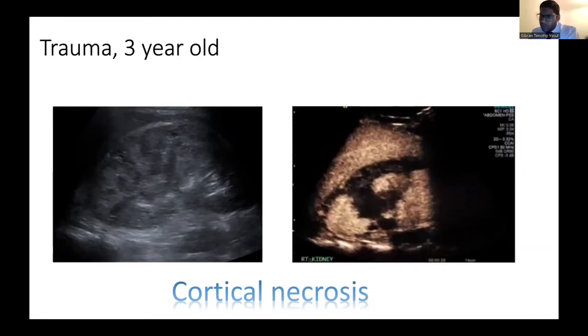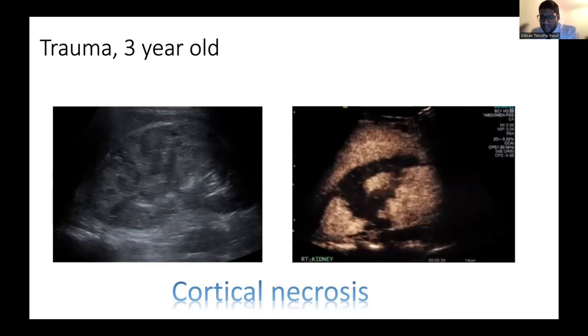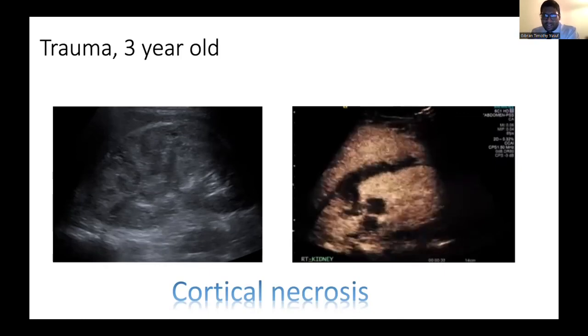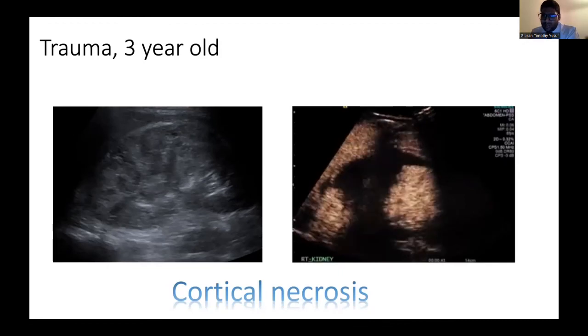If you have a pseudoaneurysm within there, it becomes very obvious. It's very clear to see because it's continually arterially enhancing. So it's not like you're losing it because the phase washes out. The arteries still remain the arteries.